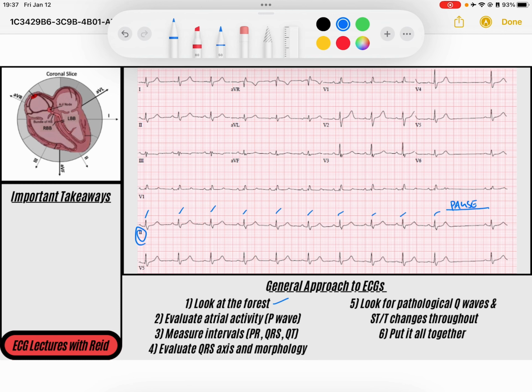And I scan through, I see my rate. This QRS ends on a solid line, so 300, 150, 100, 75, 60, somewhere maybe 65 beats per minute. And so go ahead and note my pause, like we said, and so we've got a narrow QRS. Let's see what the atria is doing. So look for a P wave.